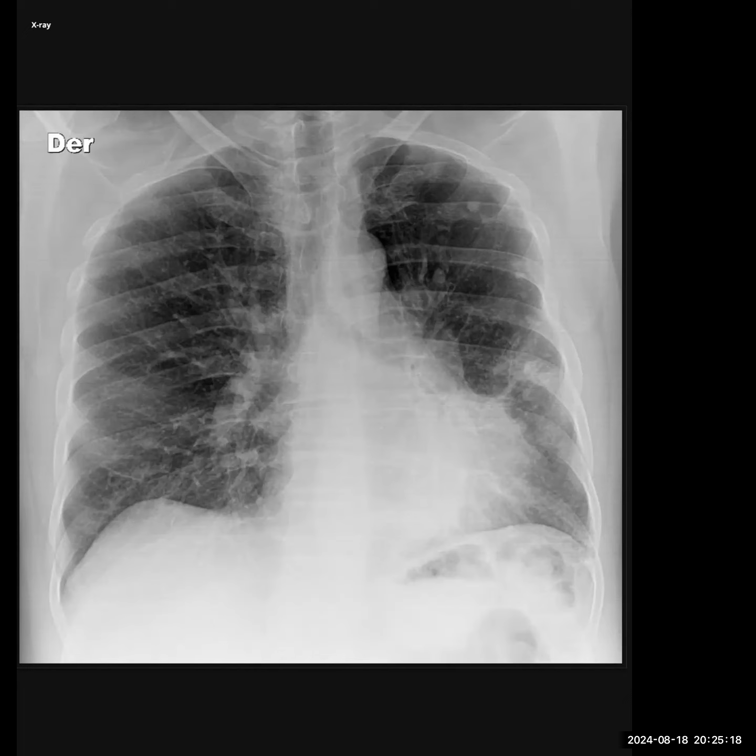So I would convey these findings to the referring clinician. A CT of the thorax should be ordered for this patient, and an immediate discussion in the lung cancer MDT needs to be ordered.